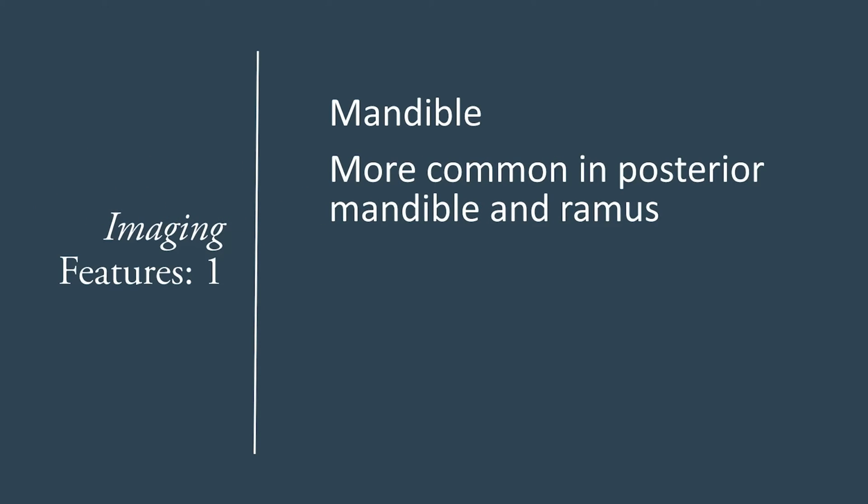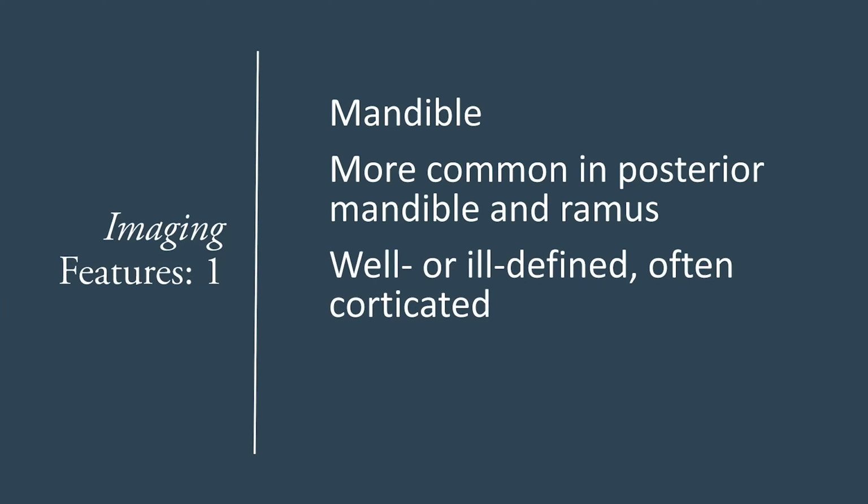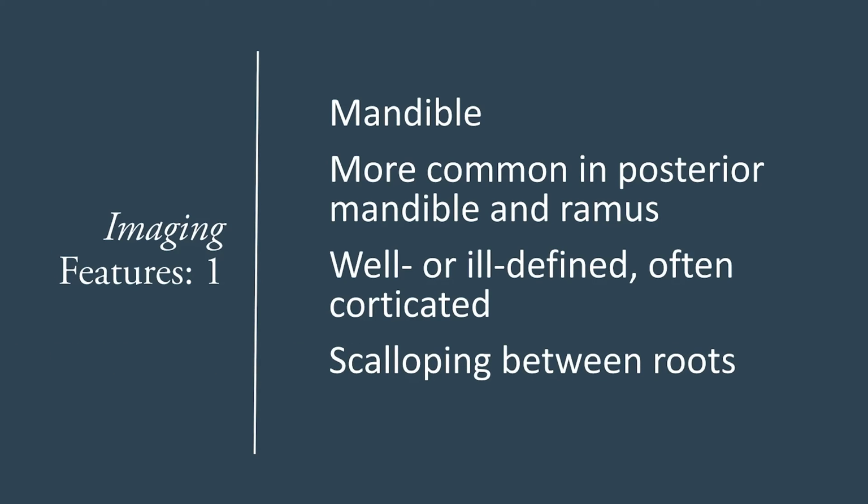The border of these defects can be corticated or non-corticated. In our case, the border was mostly corticated. One finding is that the defect scallops between the roots of the adjoining teeth.